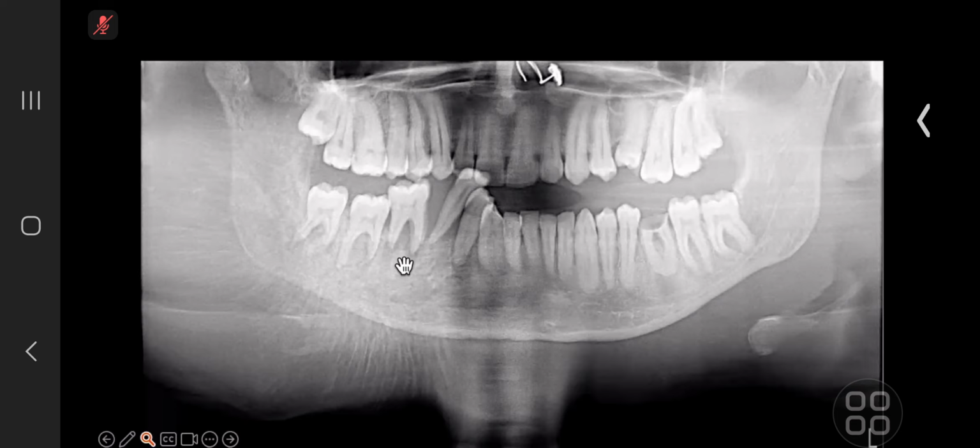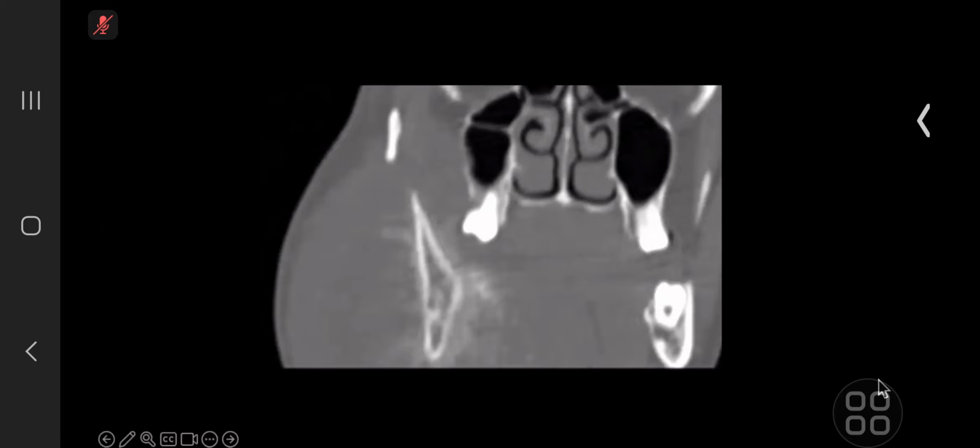I'll come back to this X-ray. I'll explain. So that's the CT. We did CT. On these coronal images with the bone windows, there's quite diffuse periosteal reaction surrounding the right mandibular ramus. And again, we can see there's a large soft tissue component associated with it. This has aggressive features, the periosteal reaction.